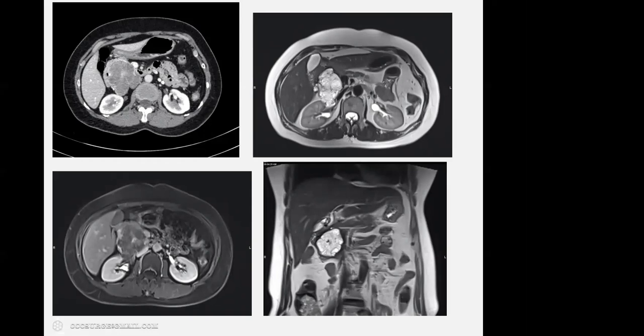I don't know, probably not, because if you see more and more cases, you will find that a big mass causing not much liver metastasis, not that ugly looking, not encasing those critical vascular structures around the pancreas, should not be pancreatic adenocarcinoma. It should be someone who is more dormant type, like a more benign type of tumor. But you're not sure whether it is solid or cystic.